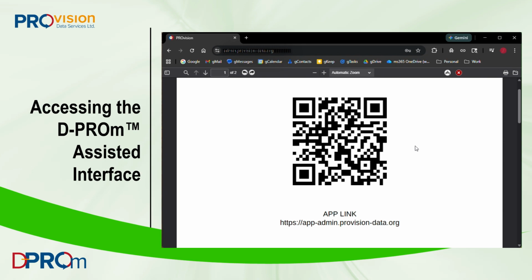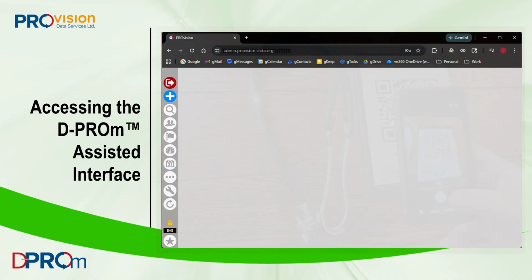After the verification step is complete, the administrator can close this view on the PROview interface by clicking the red X toward the top right area of the screen.